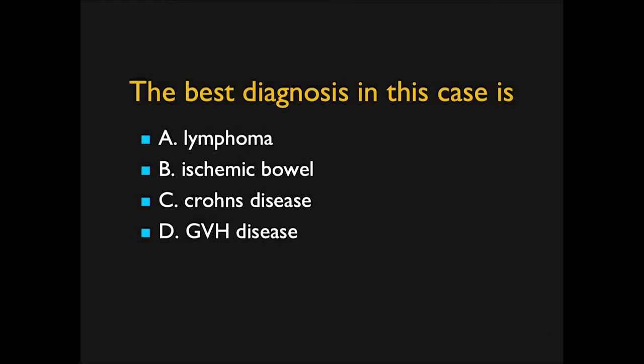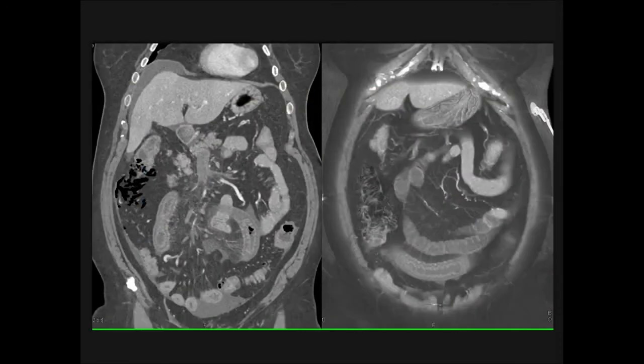Now, in this case, I ask, what's the best diagnosis? What you see on these coronal views, image on your left, you see thrombus in the portal vein and SMV. You then see thickened bowel with really what looks like a halo, diffuse edema. There's no obstruction, so it's not like a midgut volvulus, but what you're looking at is portal vein occlusion, and this patient's diseased bowel.